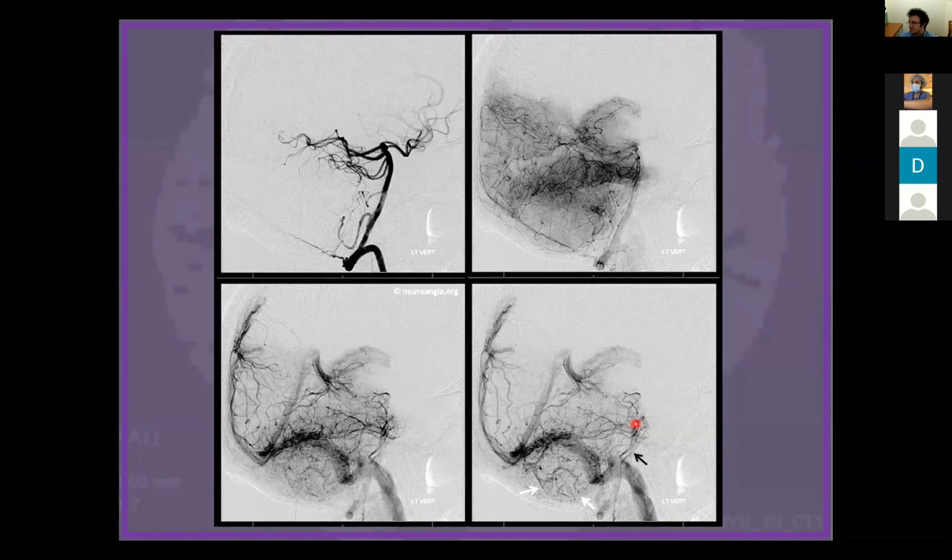So, okay, going forward, this is the lateral view of the same person. In the lateral view, of course, you're superimposing the more normal right side on the left, so it's not as different. But you can see there's congestion here. Here's your anterior pontomesencephalic structures.